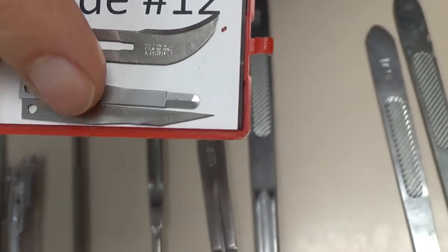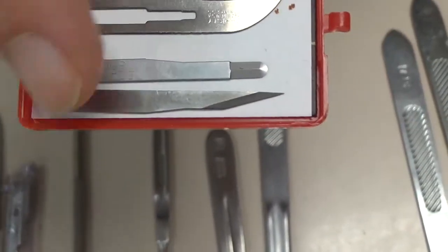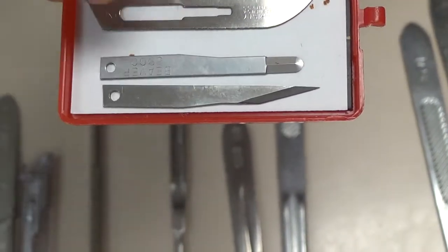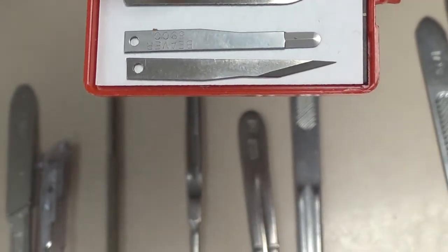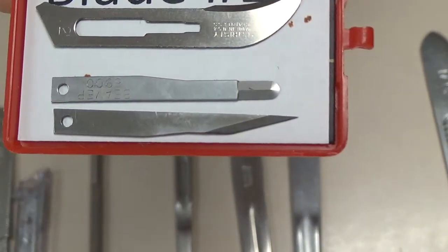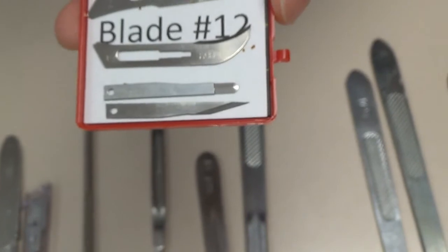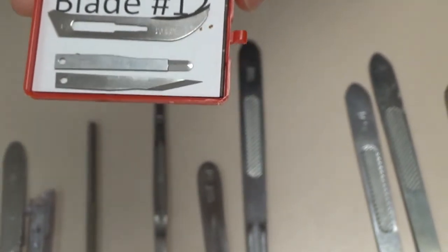On the very bottom here, you will see what we refer to as beaver blades, and these are just a few examples. There are all different kinds of beaver blades that come in all different sizes and shapes, and again they will be numbered similar to how these are, and you can see that the cutting edges on these are even smaller than any of the other blades that we saw. So those would be, of course, on very small anatomy, very small dissection and incisions that we might be using those types of blades on.